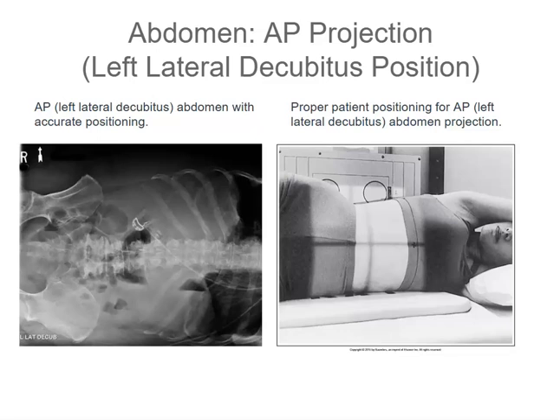The spinous processes, again, should be aligned down the midline of the vertebral column with the pedicles at equal distance from them. Iliac wings should be in symmetry.